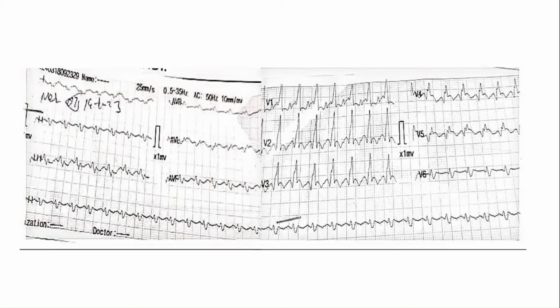So can you please apply these criteria and see which criteria are being met or rejected? Good. I beg your pardon, sir, there was an interruption in your sound. I just wanted to tell you, please can you apply the criteria you have just mentioned, so that the others will also know whether the criteria are being met or not.